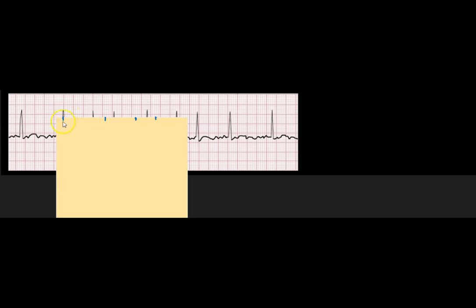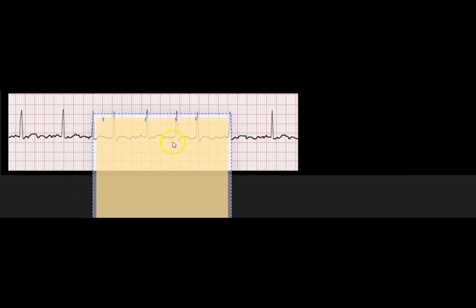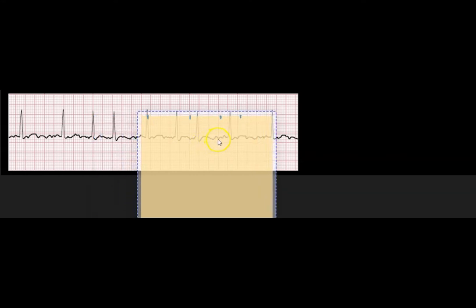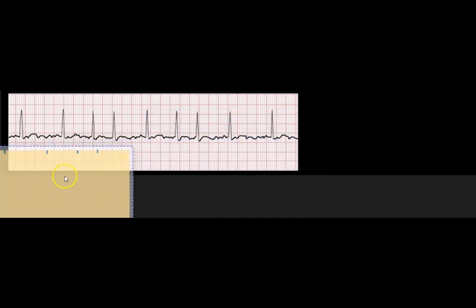You can see that these things, if they were regularly irregular, they should line up, right? Some form of that. But these things are not lining up at all. We don't see that there is any regularity to it. Even when we get to this one, maybe every once in a while, but it's not lining up with the other ones. So that's why we're now coming in here and we're going to definitely call that irregular.